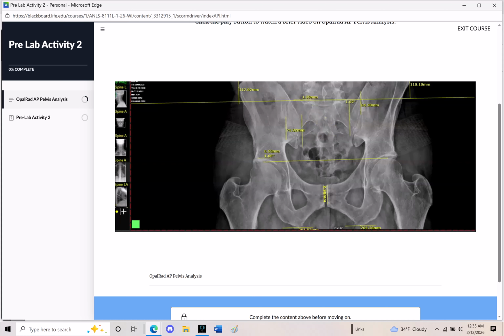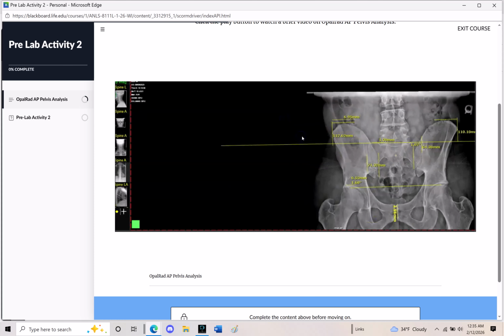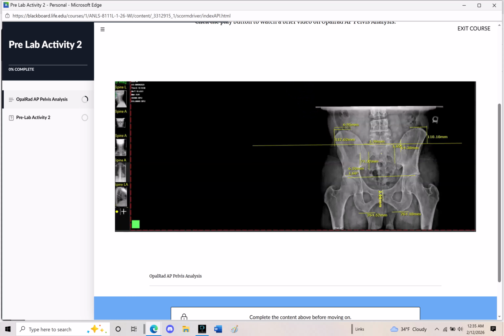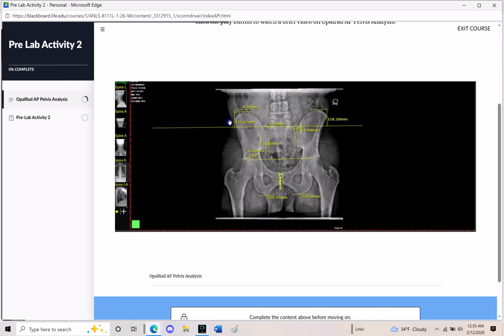Let's go ahead and shrink our view so we can see the picture here. There we go. That image, pull it back over. Fantastic. Now what we need to do is identify each of our lines. So we definitely have right on the right. Looks like our MD is over here. Let's go ahead and start with MD. Identify what our MD is. Put that right here. MD equals. Identify what that is. Yeah, I like that. That looks pretty good.